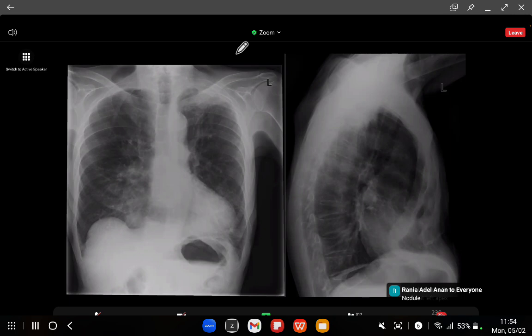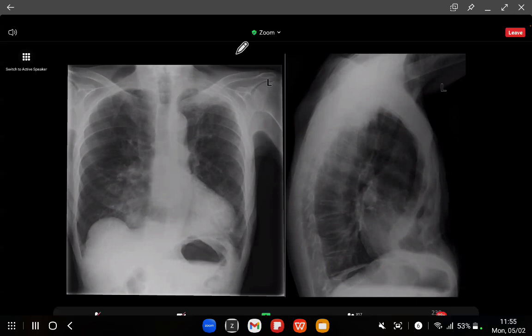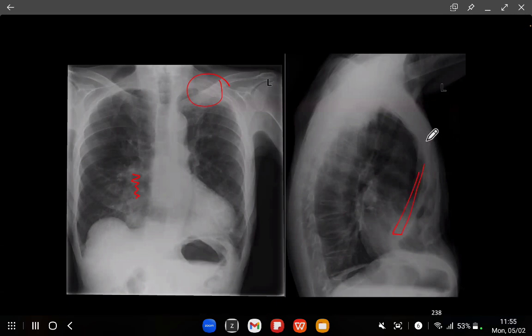So the Pancoast tumor is causing the problem up here, and this is the pectus excavatum. So there's the sternum, and it should be here. There's definite pectus, which is causing this change here, but don't forget there could be a Pancoast tumor here.